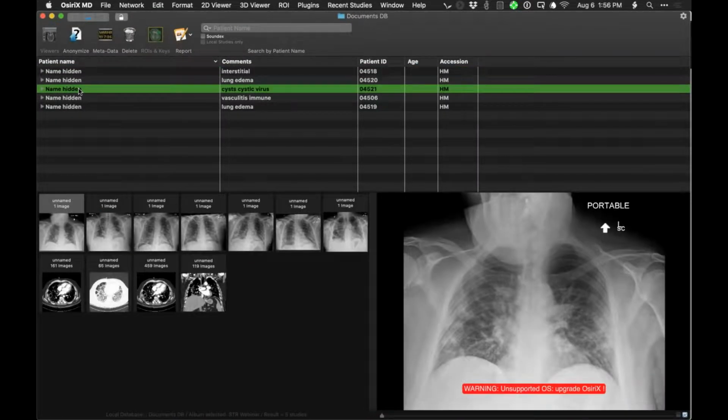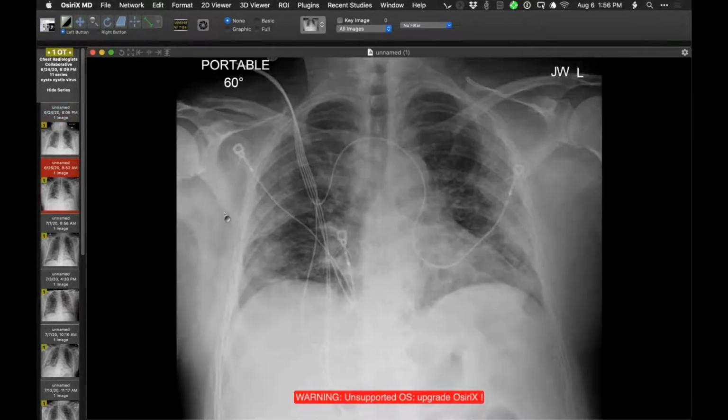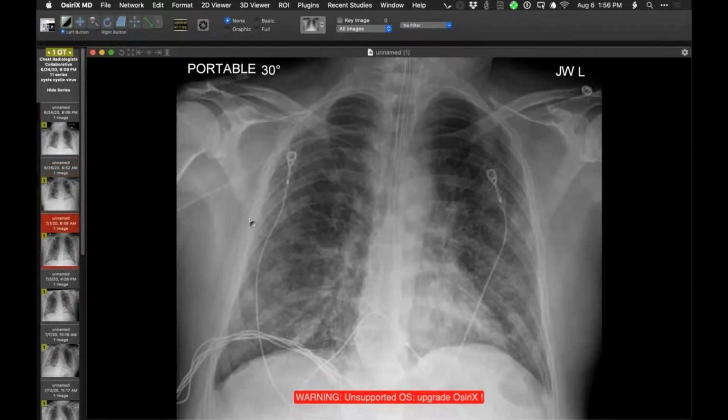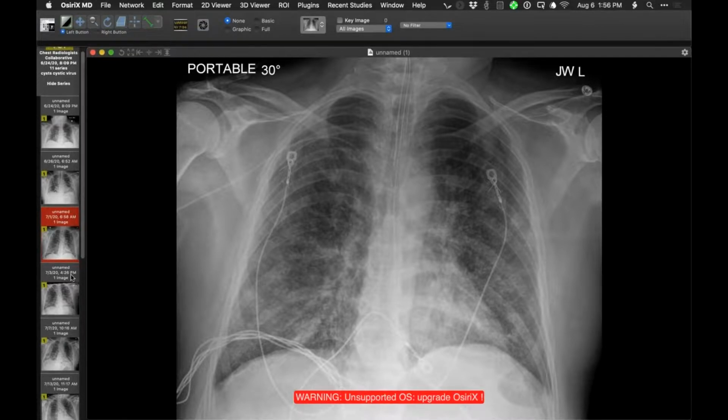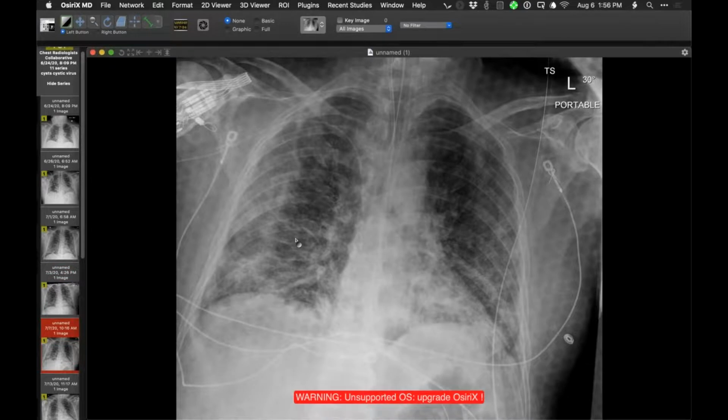Oh, this one is really unusual. So I was surprised to see this. And then, of course, I'd like to know if you've either seen this or heard about this. So COVID pneumonia. I'm going to go forward in time. This radiograph from June 24. July 1, patient is sicker and is now intubated. 7-3, 2 days later, looks like that. Forward 4 days. Looks like that.